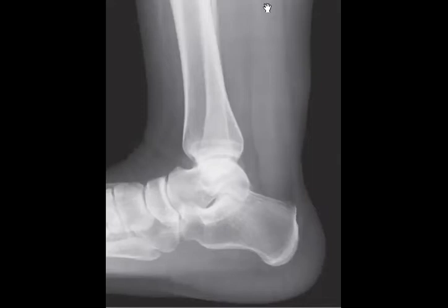So at least we have this longitudinal soft tissue. Yeah, thank you, Ada. Good trial. Already this fat plane is obliterated by soft tissue tumefaction. So do you have any suggestion before I show you the MRI? Maybe accessory muscle. Okay, Dr. Fauzi. It could be an accessory muscle, and if it is not an accessory muscle, what could it be?